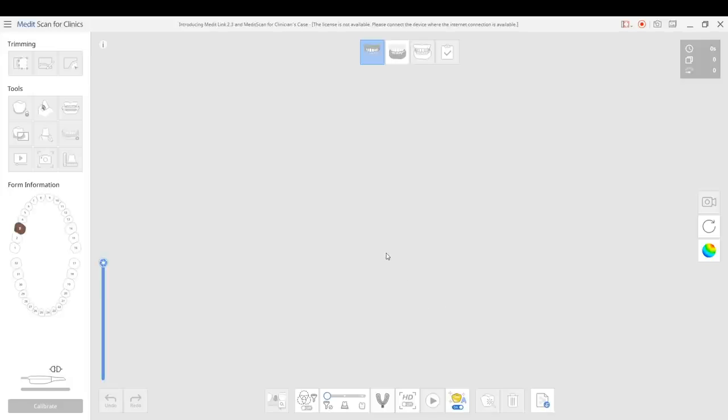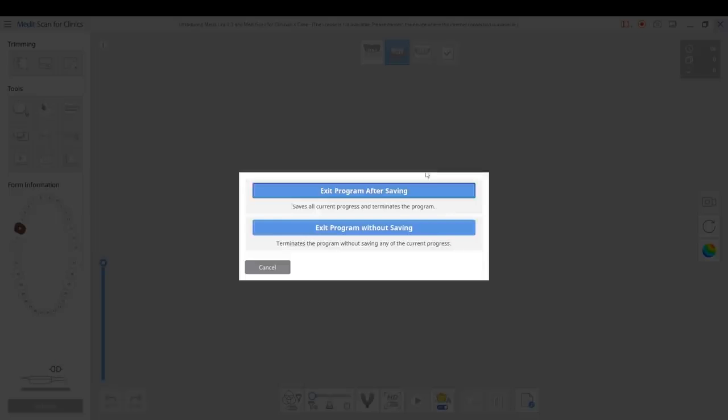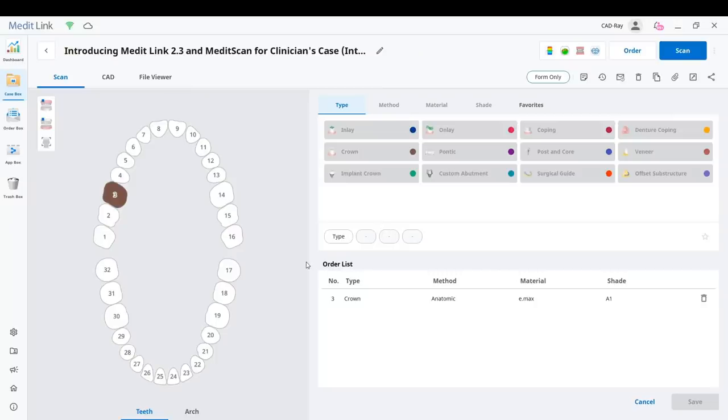We'll trash that. And what you simply can do is you can take the upper jaw scan, you can take the lower jaw scan, and then you can take the bite scan. We'll demonstrate all these in subsequent videos. Now you'll notice there's only 3 models here. Let's close that and exit without saving. And now let's go ahead and add the pre-op, and let's add the face scan like we had before.